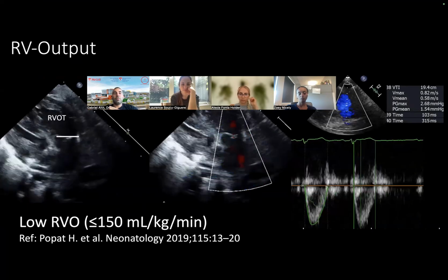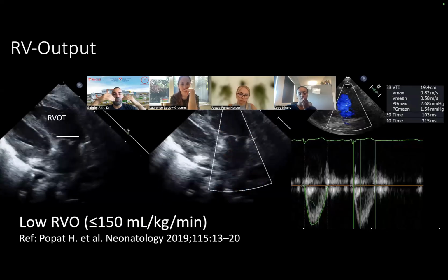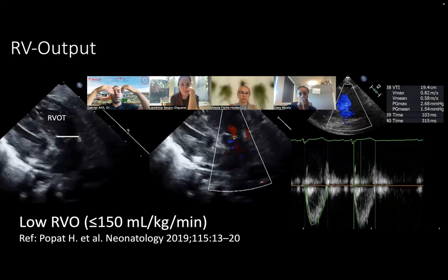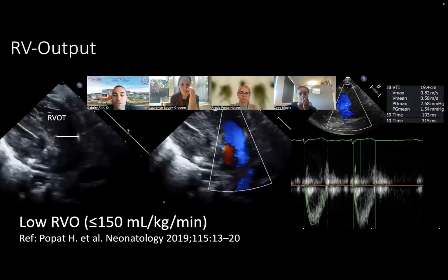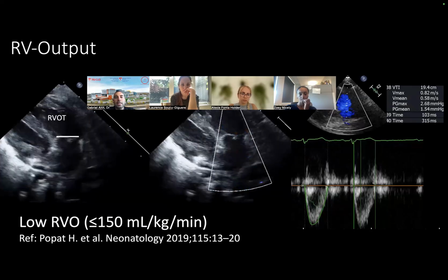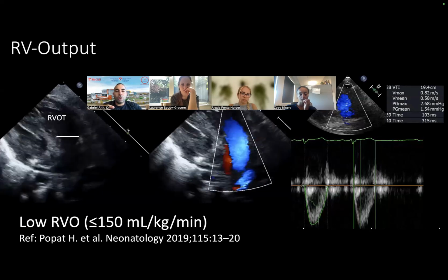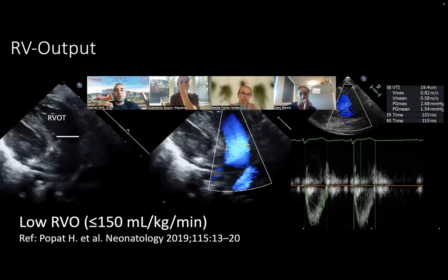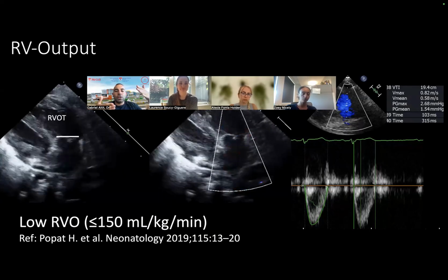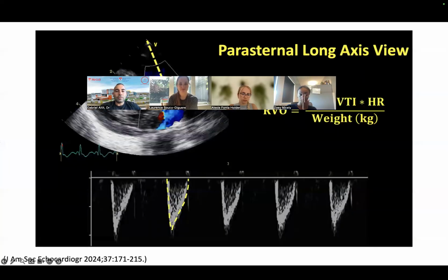And then you have to keep in mind that, for example, if you have a pulmonary valve that's doming, which means it doesn't open fully and nicely, you can have some degree of RVOT obstruction and pulmonary valve obstruction. And if there's a large PDA downstream to that, you will not have a gradient that is very high because your PDA is sending pressure into your main pulmonary artery via the aorta. So the gradient between that valve and what is happening in the MPA may be obscured by the fact that there's a duct that is still open.